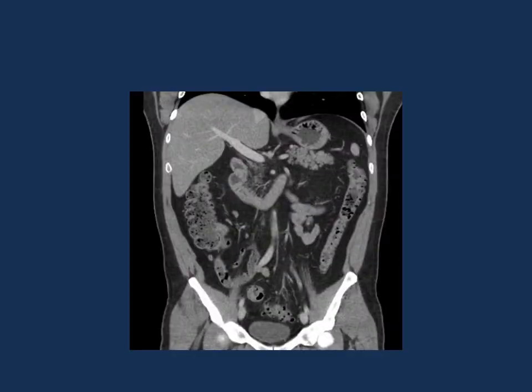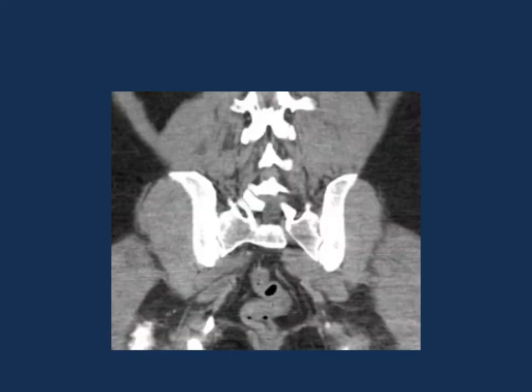One more thing to keep in mind when you look at CT scans on people that have not had colon surgery, the ascending and descending colon will always sort of be right in front of the kidneys because they're attached to the retroperitoneum. So that's why the cecum and descending colon are both, when we're scanning, on the same plane, right? The sigmoid colon is going to go in and out because the cecum and descending colon are fused to the retroperitoneum. So you expect to find them in the same place.